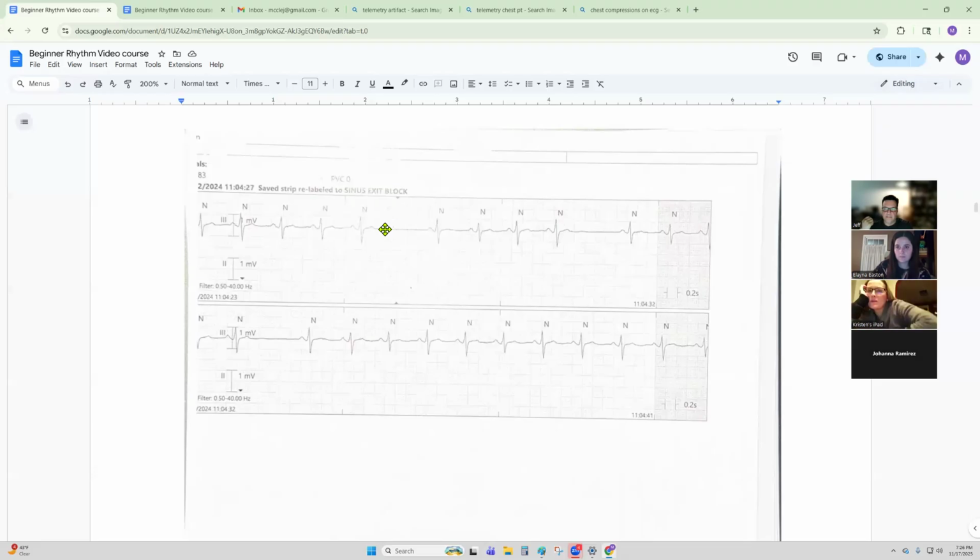I can zoom in too. Oh, that doesn't zoom in on your screen, does it? No, I just see a big hand. Oh, okay. Sorry. I was zooming in to make sure there's no P in there. I can do it too. That's awesome. I didn't know that. Oh, can you? Yeah. Oh, good.